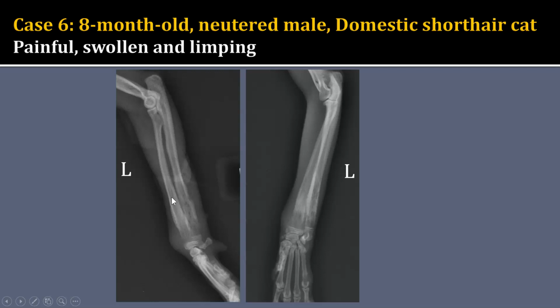And then these bones also have some periosteal reaction. So here I see some solid and some irregular periosteal reaction that's on both the radius and the ulna. One thing I forgot to point out is that there is cortical lysis on both the radius and the ulna as well. So this is actually a fairly aggressive looking lesion because it has that moth-eaten and permeative lysis. The transition zone is actually pretty indistinct as we go from normal to more and more abnormal bone. The periosteal reaction itself, though, is a kind of non-aggressive reaction.